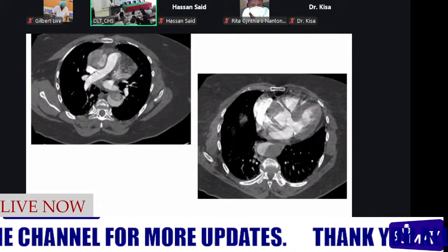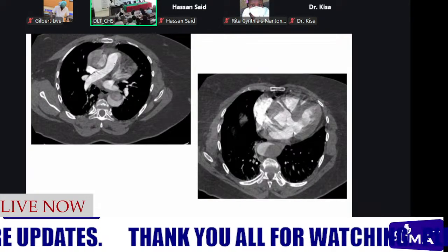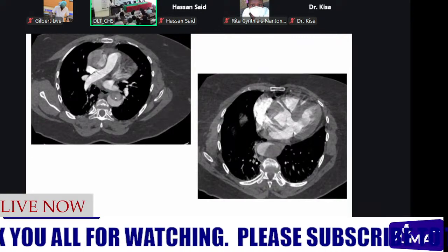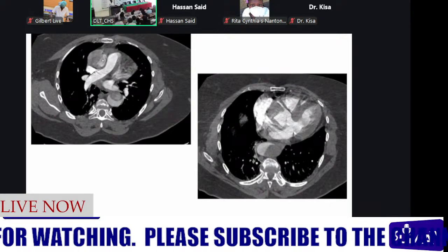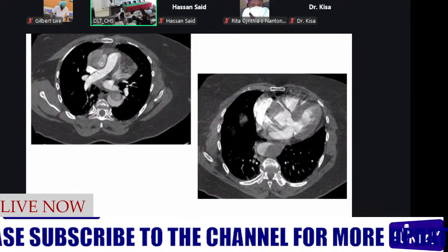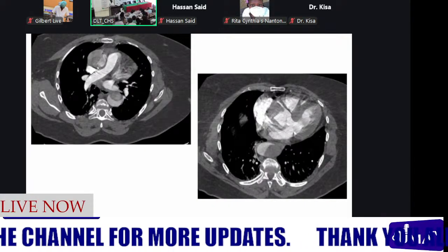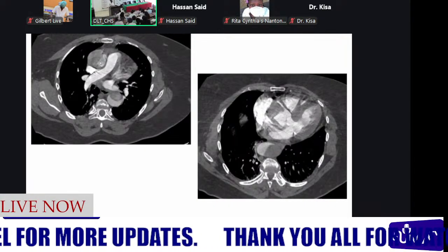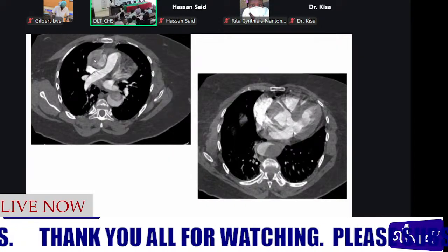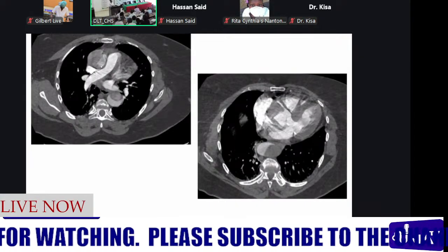Then this one, we are cutting going down. Here we are at the level of the bifurcation of the main pulmonary artery. We are seeing our ascending aorta here, then the descending thoracic aorta. And still we are able to appreciate the intimal flap with the double density within the aortic lumen. We have our true lumen, which is surrounded by a larger false lumen. When the false lumen is very large, it compresses on the true lumen, and we can have a compromised flow to the peripheries.